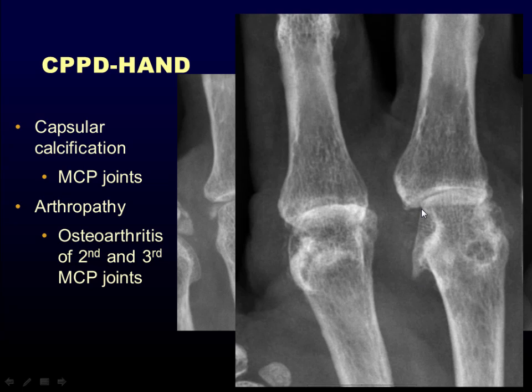Notice the large beak osteophyte. Now they still have asymmetric joint space loss, subchondral sclerosis, and osteophyte formation, what looks like OA, but it's in an atypical distribution. You'd ask if this patient did a lot of manual labor. Are they a jackhammer operator? The other consideration would be for a CPPD arthropathy.